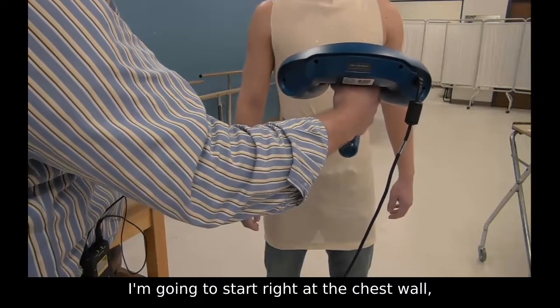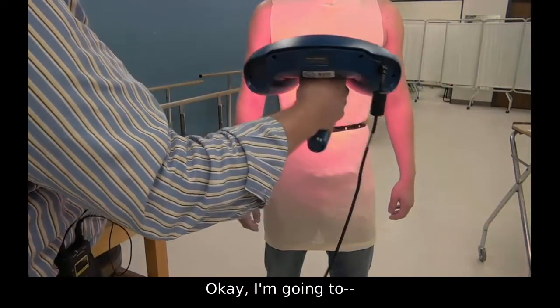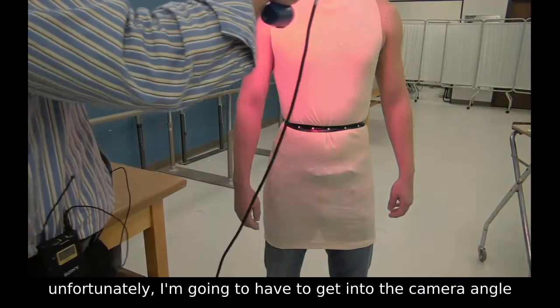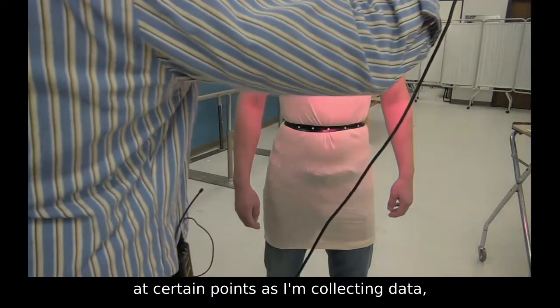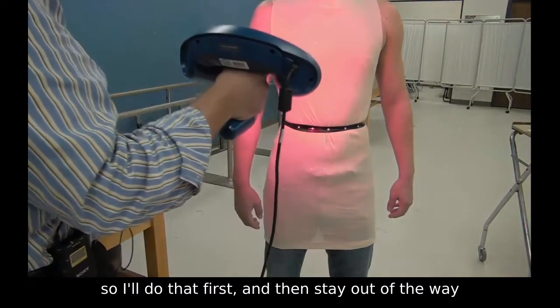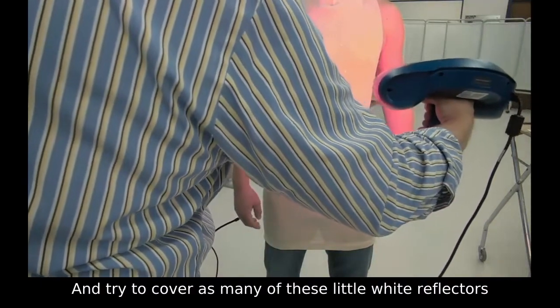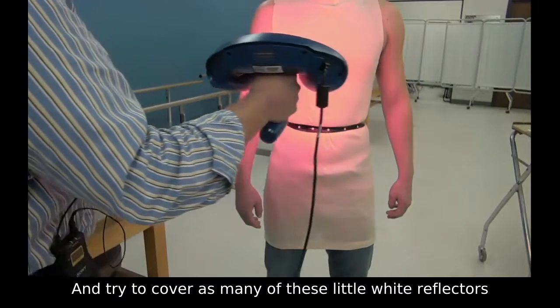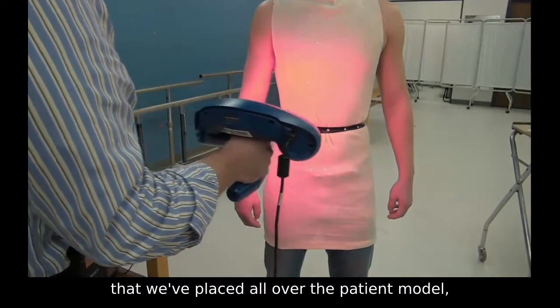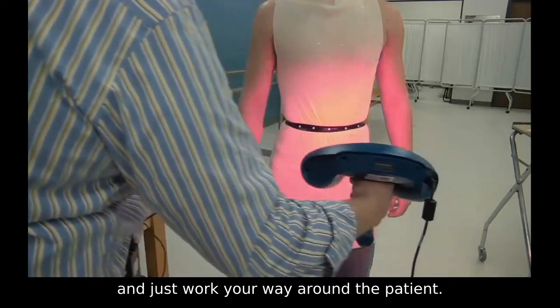I'm going to start right at the chest wall, and we can see that red crosshair. Okay, unfortunately, I'm going to have to get into the camera angle at certain points as I'm collecting data. So I'll do that first and then stay out of the way as much as possible. And try to cover as many of these little white reflectors that we've placed all over the patient model. And just work your way around the patient.